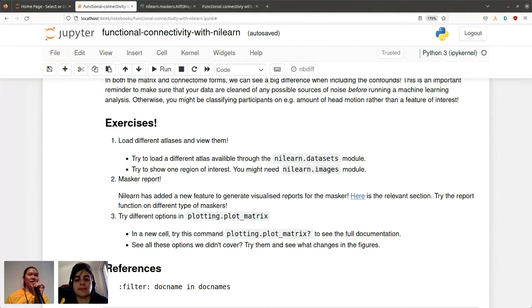So we will simply include those variables as regressors in a linear model to attempt to remove those signals. There is simply no best method to remove the noise. We can only do our best. So from the fMRI analysis viewpoint, that is how it works.